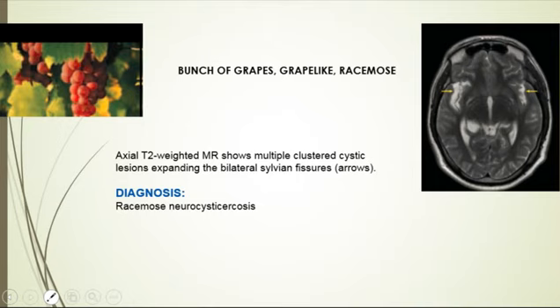Five stages. The non-cystic neurocysticercosis, the first stage, is asymptomatic. Okay, no imaging findings. Just don't care about it. We have nothing to add for that. The vesicular neurocysticercosis has a parenchymal and/or subarachnoid cyst with associated scolices. It's called cyst with dot appearance. Yes. Cyst with a dot, okay? And little or no edema.